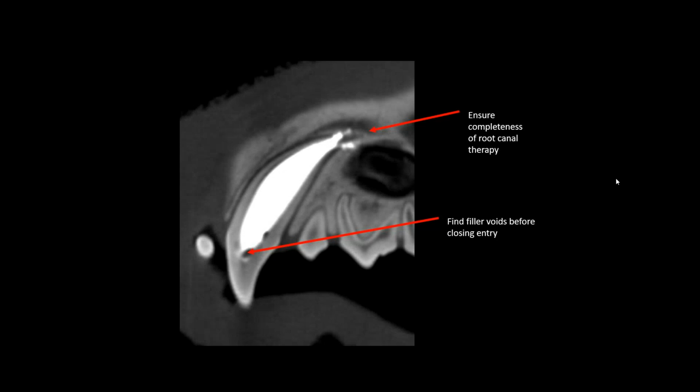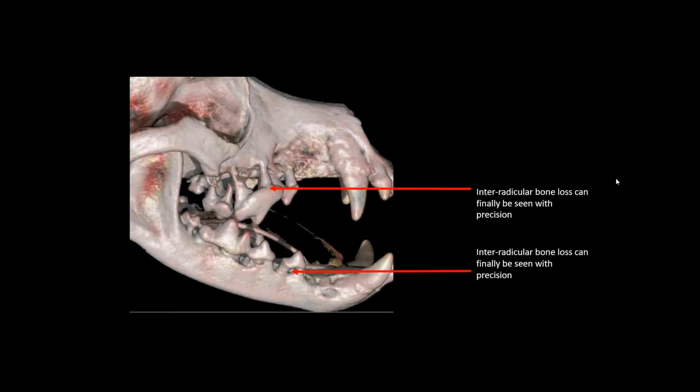And if you imagine where a periapical X-ray would be, again, this is buccal, this is sort of lingual on this side, you can easily understand that the projection of the gutta-percha onto the root would make it difficult to decide where the end of the gutta-percha might be. Whereas with a VetCAT CT, you can see it very well.